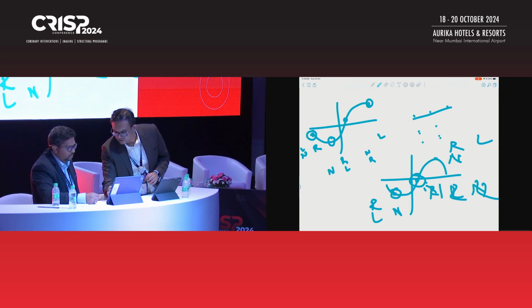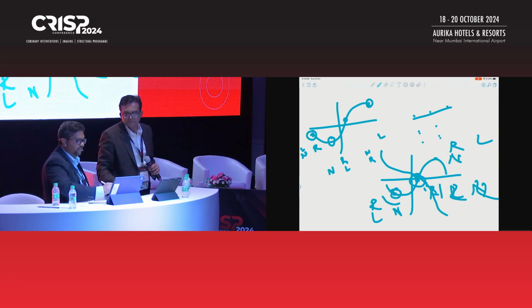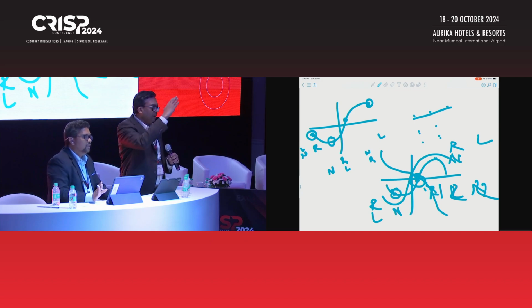Now when you get the device, this is the S curve for the cusp. When you get the device S curve, it will be somewhere cutting like this, and where both cut each other, that will be the ideal point. So the device curve is something like this. I have drawn the device curve. They will cut at one point.